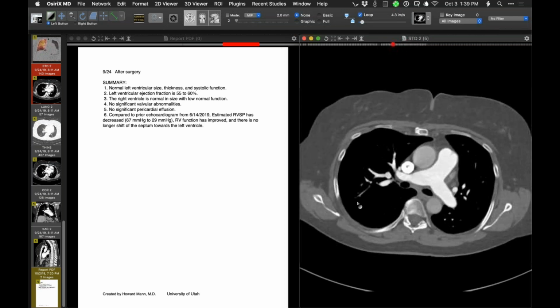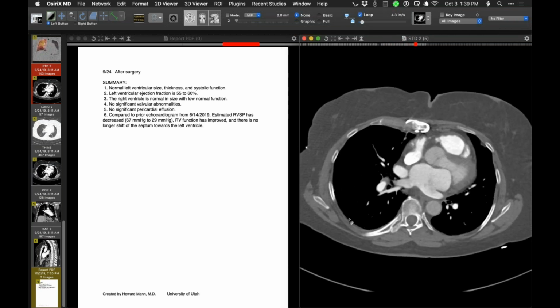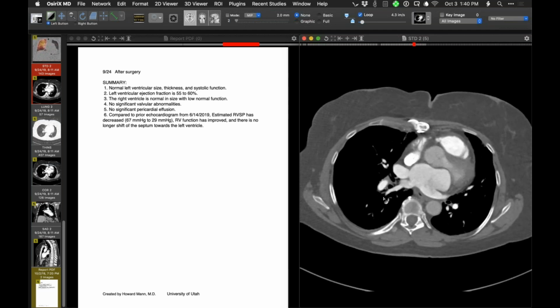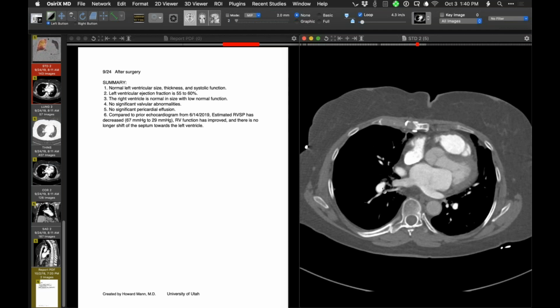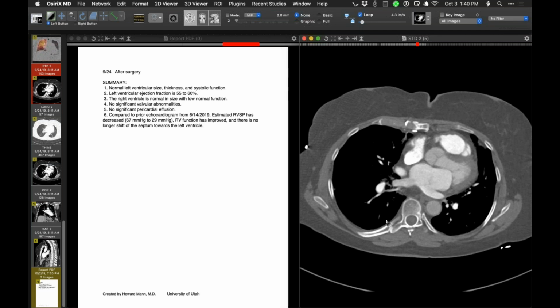This is one of the nicest ones I've seen, in which the webs, the stenoses, and particularly the right lower lobe vessels really opened up nicely. I wish I had pictures of what was taken out there, but I imagine you took out a lot of organized thrombus during the endarterectomy procedure from the right lower lobe right there. That's pretty dramatic. Howard, could you see the left upper lobe abnormality that was?